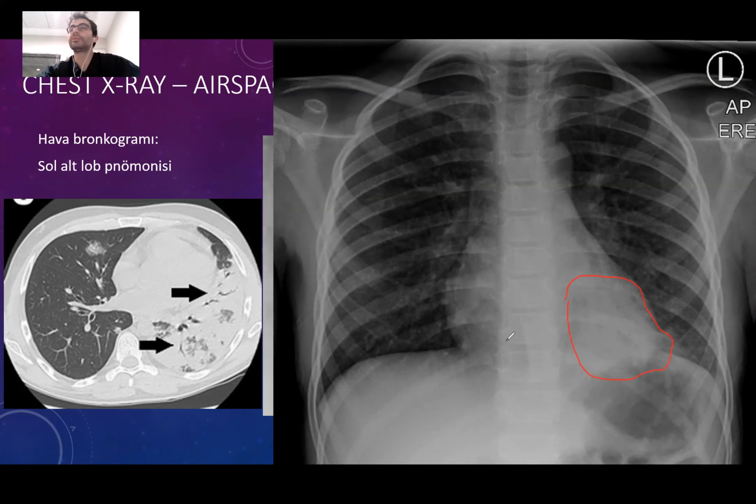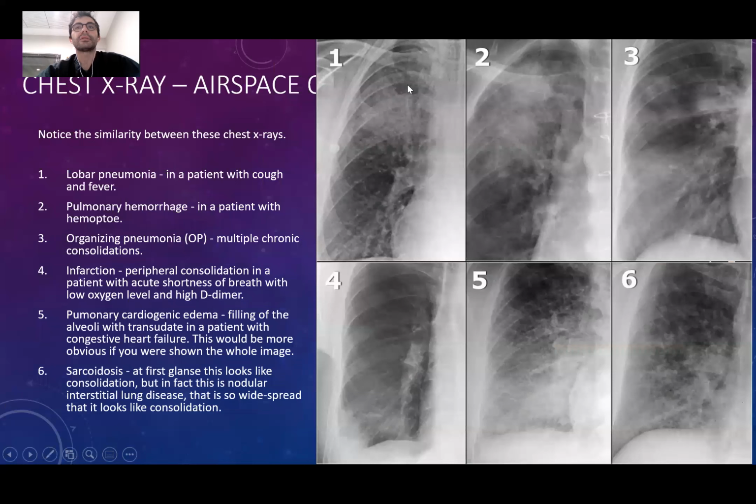As I have told you in the systematic evaluation, there is some lung behind the heart as well. We should be looking at this area, and there is lung behind the diaphragms as well. There can be mass lesions behind the diaphragm, for example, and there can be consolidations behind the heart. You should always be careful about these areas. So these are different cases of, again, consolidations, okay?